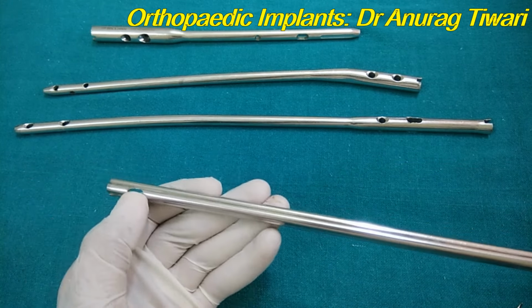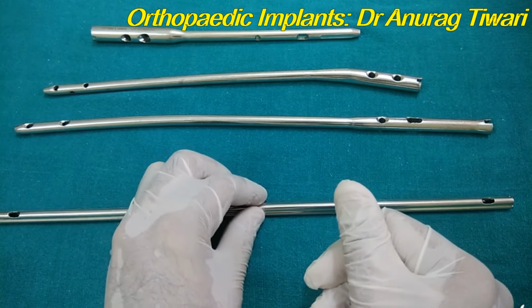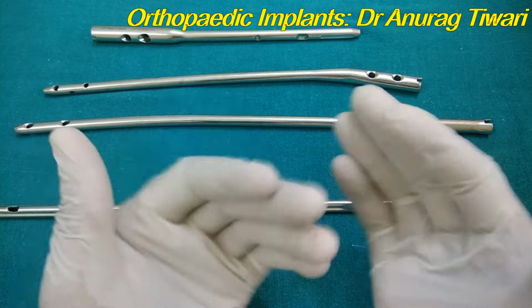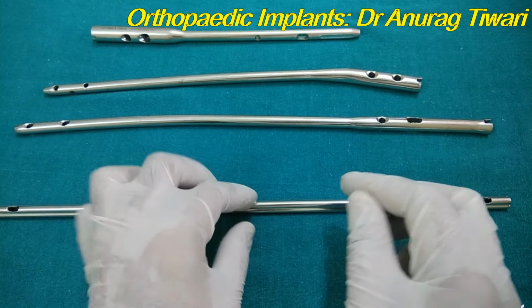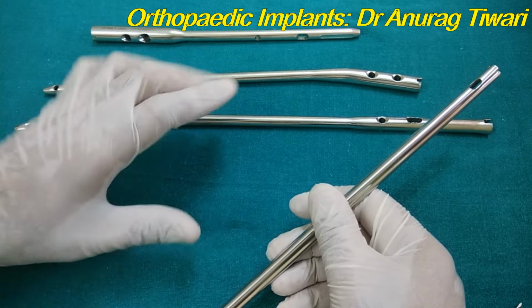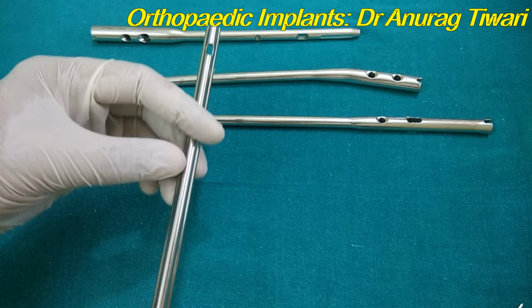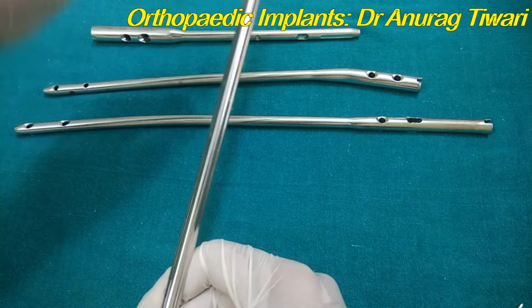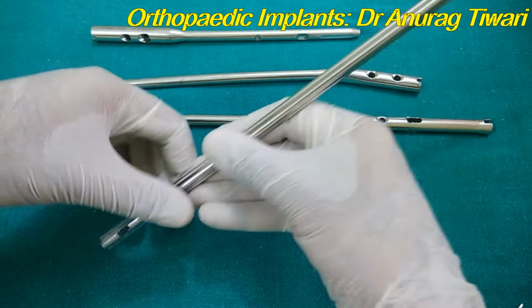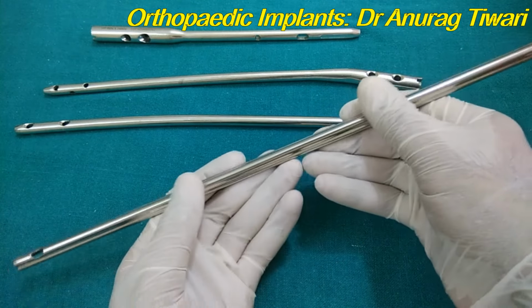What is the purpose of the other eye? I will tell you, because this nail was originally devised for retrograde nailing. So retrograde nailing was, you open the fracture site, you freshen the fracture ends, and you insert it retrogradely. For example, if there is a femur fracture, you open the fracture site, you take the two fragments. In the proximal fragment, you insert this, and once it is out of the greater trochanter, you reduce the fracture and then you insert it in the distal fragment. So this is the way you do the retrograde nailing of the femoral fractures.